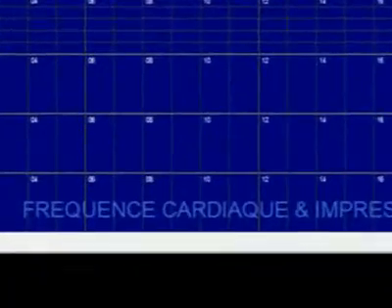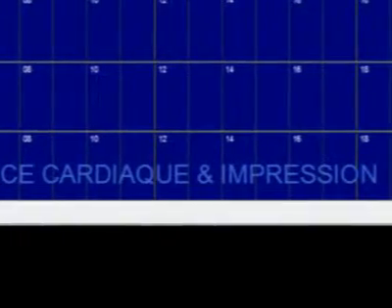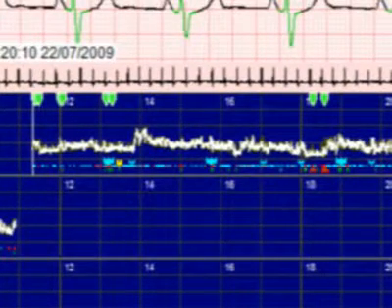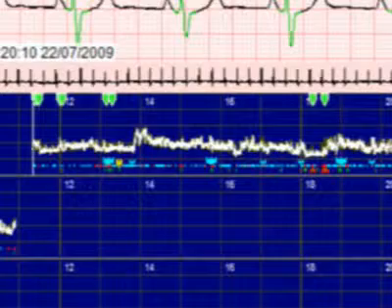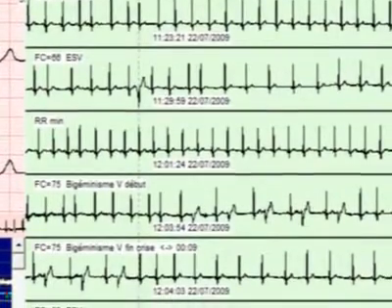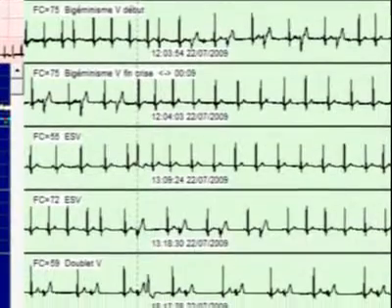When opening a patient's file already analyzed, Quick Reader goes into heart rate and print samples. The goal is to provide immediate heart rate trend and the events selected for printing. In this mode, the trends are plotted by green arrows, which correspond to a sample. Thus, we immediately locate the position of these samples over time. The top 10 appears in miniature in the right window.